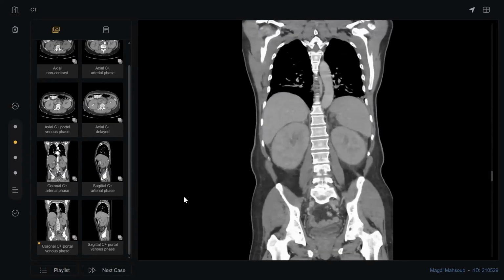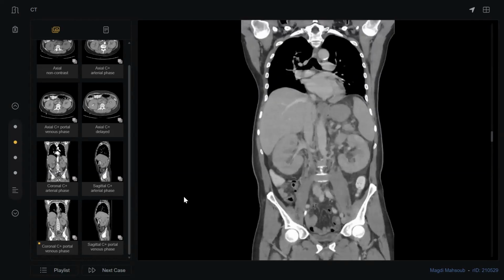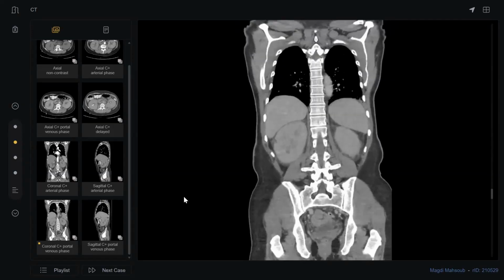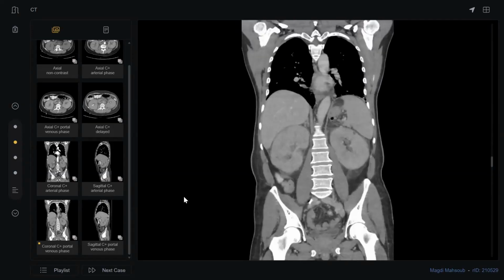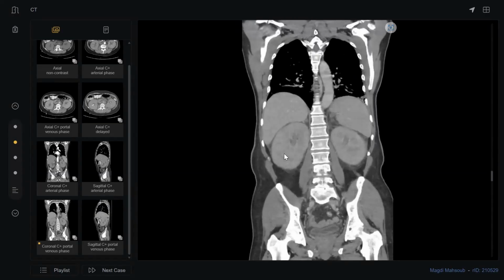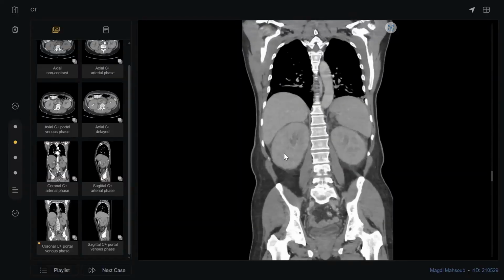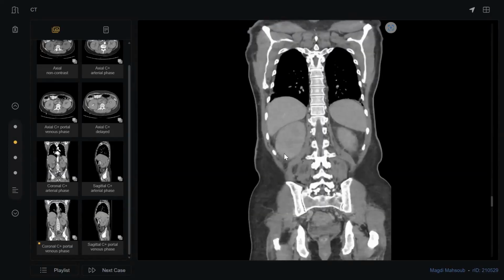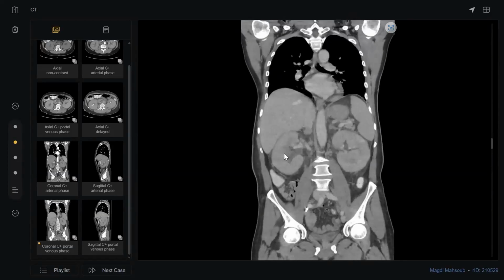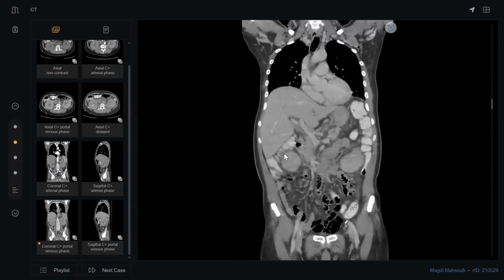In pyelonephritis, there is a characteristic appearance of both kidneys. Do you remember it? Yes, there will be a striated nephrogram. Okay, let's see if there is any striation here. Unfortunately, we didn't have the secretory phase. Do you think there may be striation? Yes, the lower pole of the right kidney looks heterogeneous in this phase. I will check the delayed images.